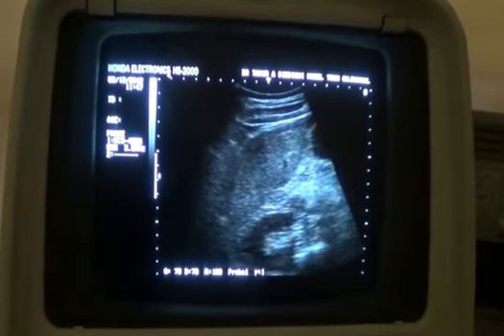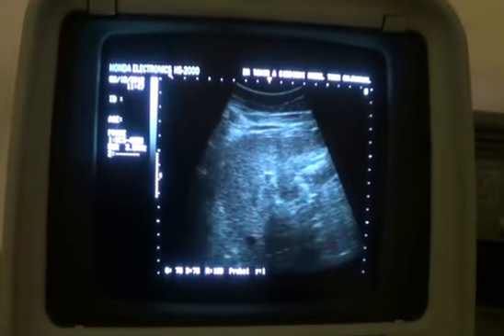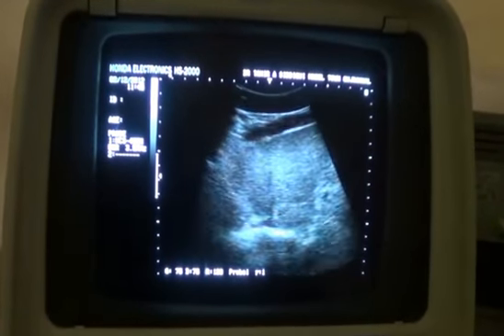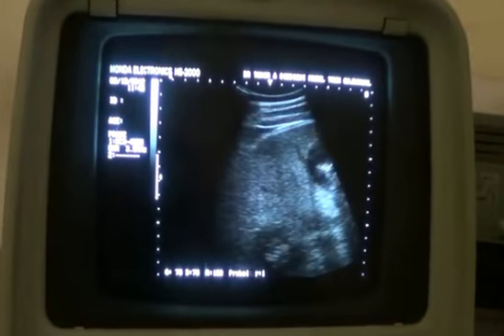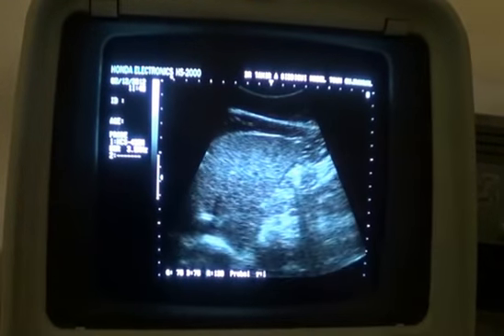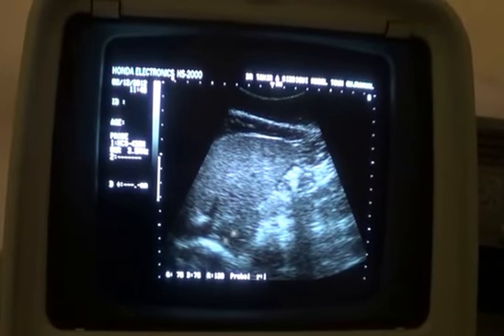Secondly, this is suggestive of the fact that the liver is enlarged. Now how much is it enlarged? See that the liver angle, well, it's not sharp, it is rounded.